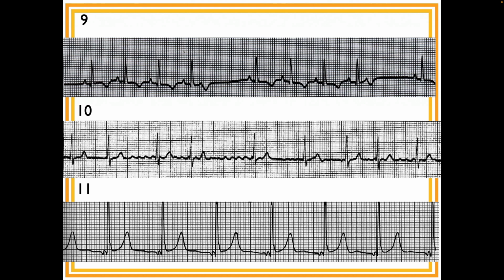One of them looks different, but most of them are smaller, so it's small. Yep. The QRS is normal. I'm kind of stuck. Okay, it's regular, so it's a junctional. Yeah. Brilliant. And which one? It's 75, so accelerated. Okay. There you go, good job. Okay, next, please.